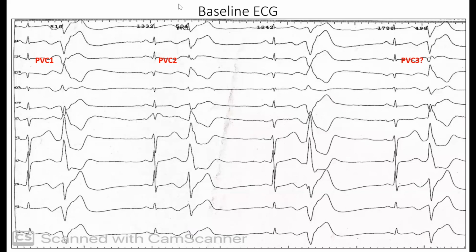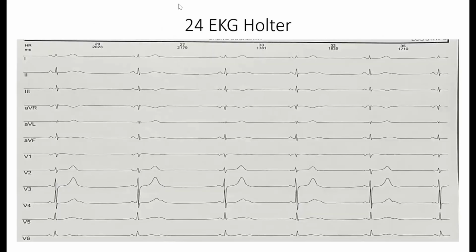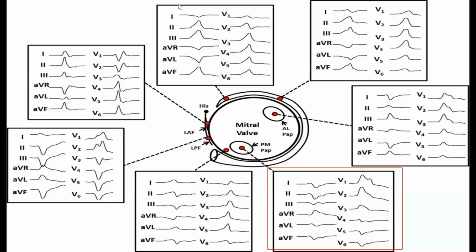You think, yes, I think from the papillary muscle. You sure? Go back to your diagram. You showed a nice diagram, differential work done by another investigator. Okay, right here. So it's a posterior papillary muscle. V1. Single hump or double hump? Double hump. Your EKG, single hump or double hump?